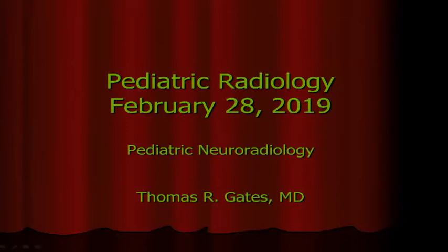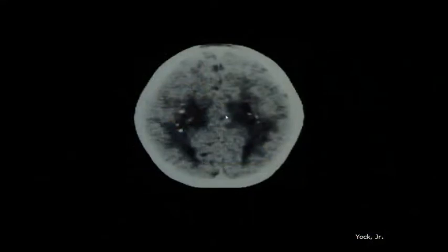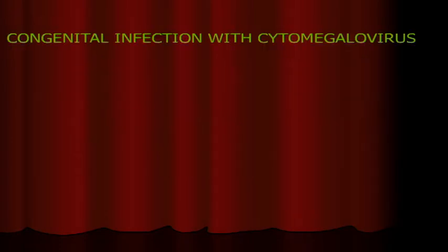Radiology for neuroradiology. When you get a CT or an ultrasound, you see calcifications in a little baby's brain. You have to worry about the TORCH infections. You can also worry about maybe tuberous sclerosis. But when you see these little punctate, deep white matter stuff, this is CMV. The CMV and toxo are your big ones that you worry about for TORCH.